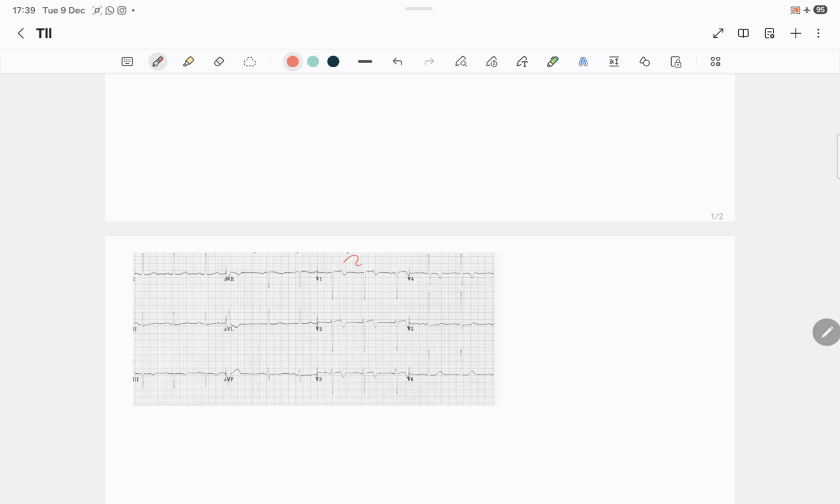And as you may observe, something is going on in V1, V2, and V3. Now, these T waves are not normal. They are bent as if someone is trying to pinch them down, press them down. I'm sure we can appreciate that there is no ST segment elevation. If you draw your line across your J point, and especially if you use your ECG ruler, you're going to find there's no ST elevation here. So there was no ST elevation, troponins were fine.